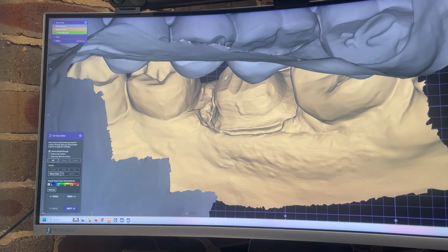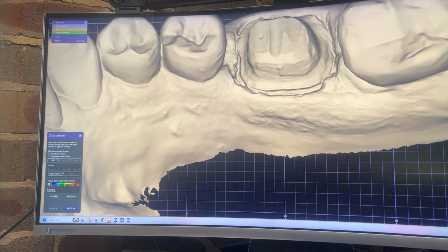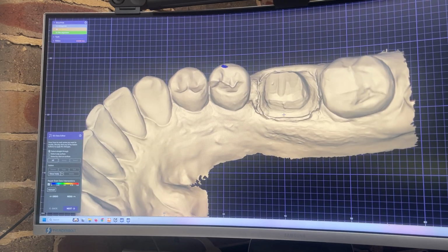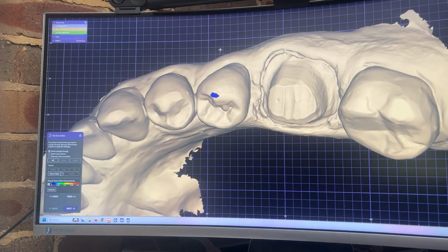I always double check if the scans are correct and if there's any anomalies. If there are, like sometimes it doesn't stitch well, some issues, I'll just stop working on it. I'll call you or whoever sent me the case and go, hey, I see something's wrong with the scan. Do you want to go ahead with it? It might be incorrect. Or do you want to get the patient back in and rescan it?